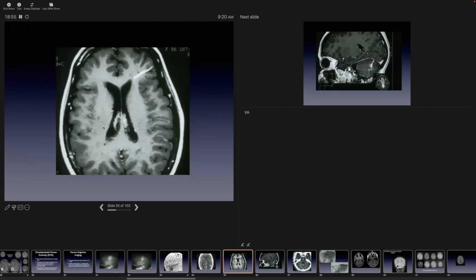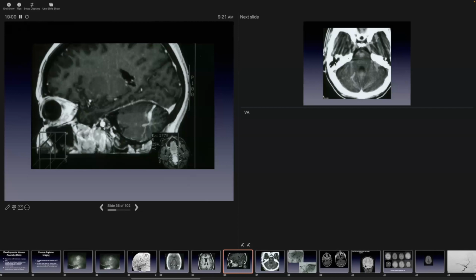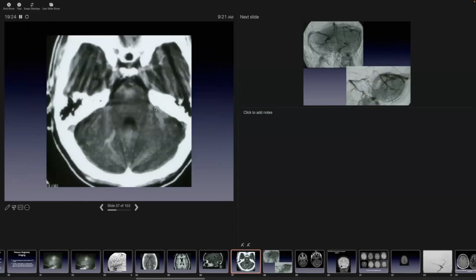Now, important to keep in mind as you think about this distinction between arteriovenous malformation and a DVA, that on conventional, in this case, MP-RAGE or some similar 3D T1 technique, all of the vascular structures enhance. And this is what argues against the presence of high velocity flow within the lesion, which would make it more typical for a vascular malformation, an arteriovenous malformation.